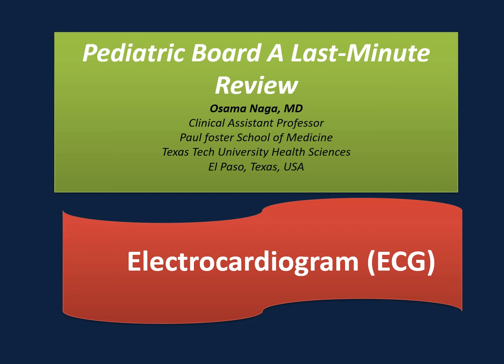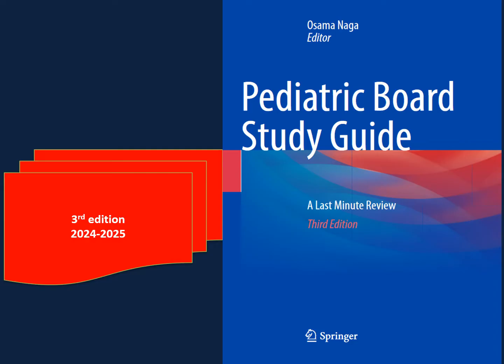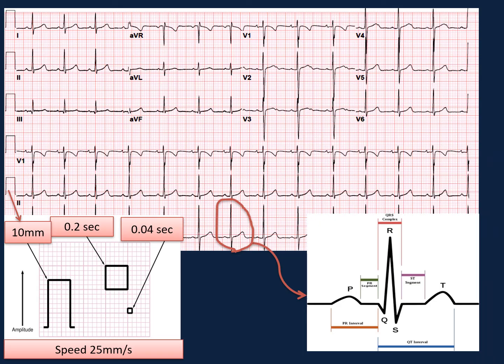Hello everyone, we'll discuss here the pediatric electrocardiogram. Check all the updated information in the third edition, 2024-2025. This is a 12-lead ECG, 10 seconds recording.